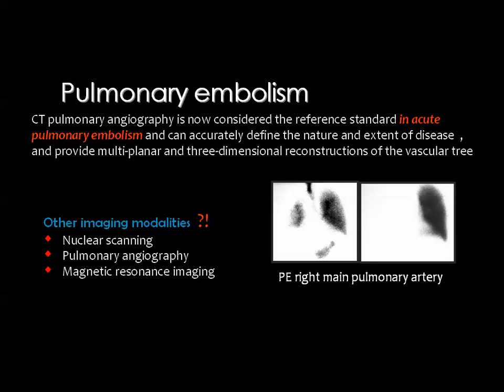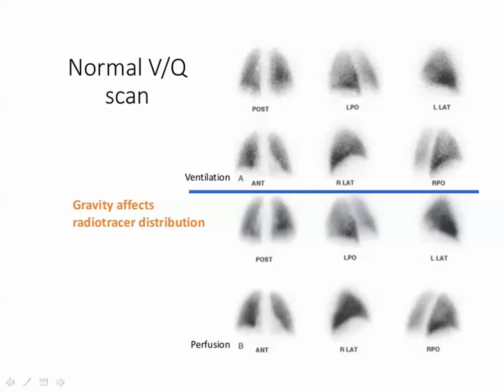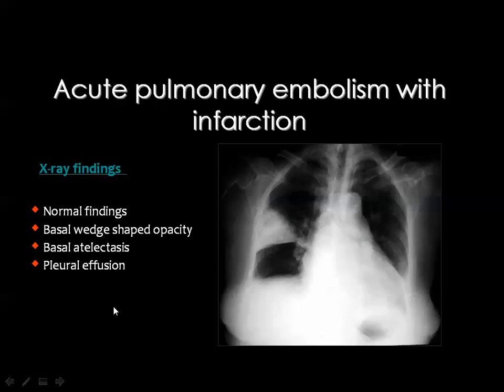whenever we came to the second issue, which is the chronic thromboembolic pulmonary embolism, then we'll have different ways of assessment. Okay, in the ventilation and perfusion scans, there should be a good match between the ventilation and the perfusion scans. And if there is a mismatch between the perfusion and the ventilation scans, we'll suspect the pulmonary embolism, as I will show to you.